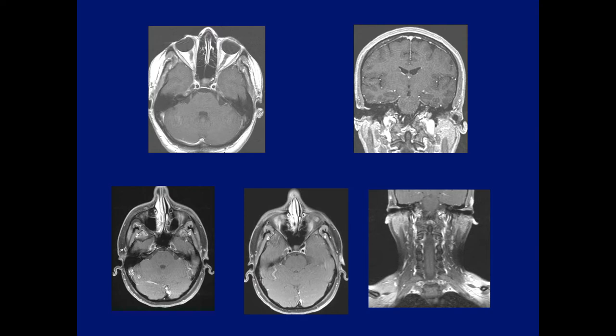Does anybody see any abnormalities on these images? Please type in your response if you have any.